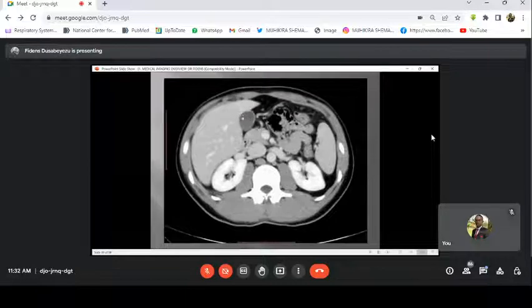These are the kidneys with contrast now. The reason why they are white, not like soft tissue, is that they have contrast within them, and contrast, remember, is very white. This is the spleen. Can you see how the spleen has the same density as the liver?